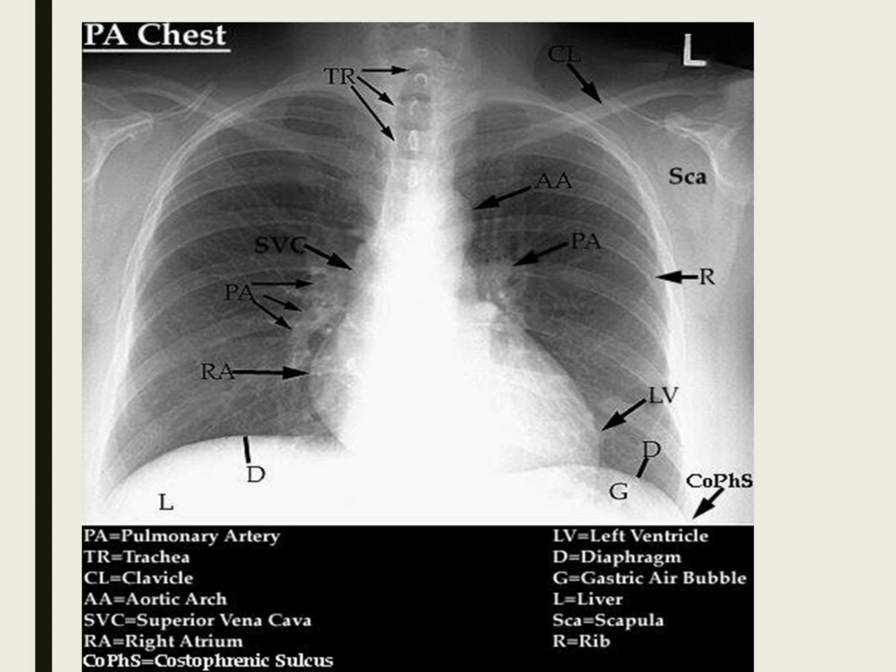That's what I always tell residents and med students or whoever: you order a study, make sure you follow the study. Don't order it just for ordering it. So look at the film, know where everything is, and then adjust. It's good to note somewhere that the tube was adjusted.